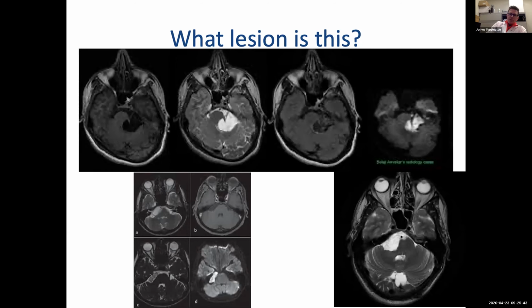And so they will typically be dark on T1, and they'll basically follow CSF. The clincher is the DWI, whether that's HASTE, whether that's PROPELLER imaging for that. And it typically lights up pretty light bulb bright with them. The history that's key for these is that these patients will oftentimes have subtle cranial nerve findings. It can be patients that say, okay, I have this facial twitching that kind of happens. You get the MRI and then you send your diagnosis.